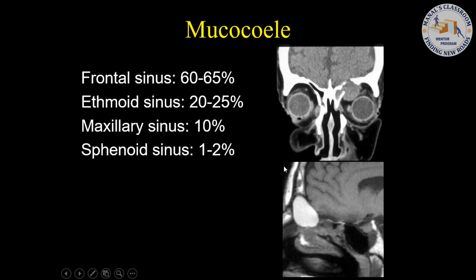So when we talk about acute sinus disease, or when we talk about cysts and polyps, these are mostly fluid. But if you have a chronic disease involving a mucocele, realize that this mucocele can eventually become dehydrated and start to concentrate protein. So this is actually a mucocele. Now when you look at this, you're going to say this actually looks like a tumor involving the frontal sinus. And mucoceles sometimes can mimic neoplasms.